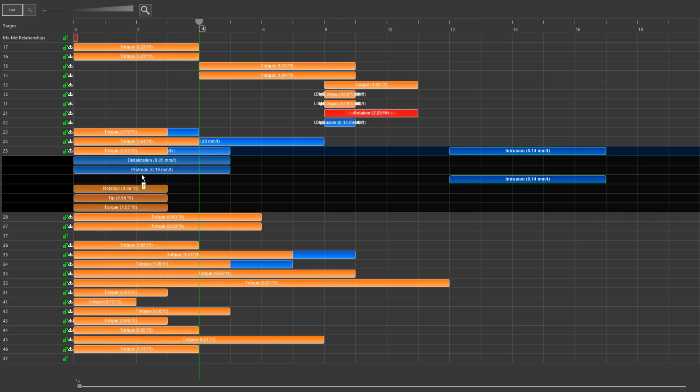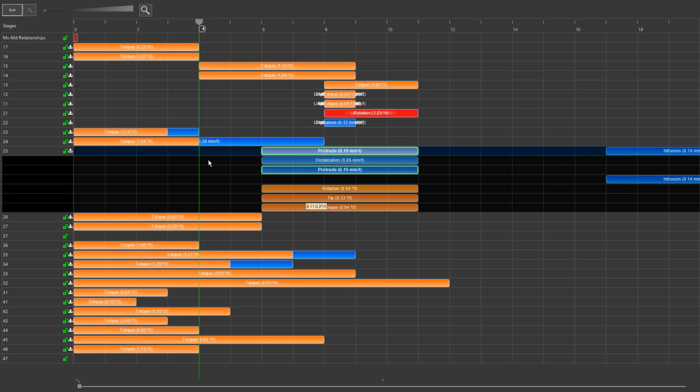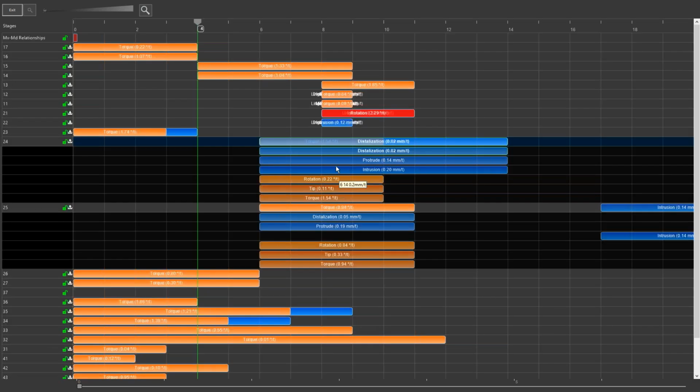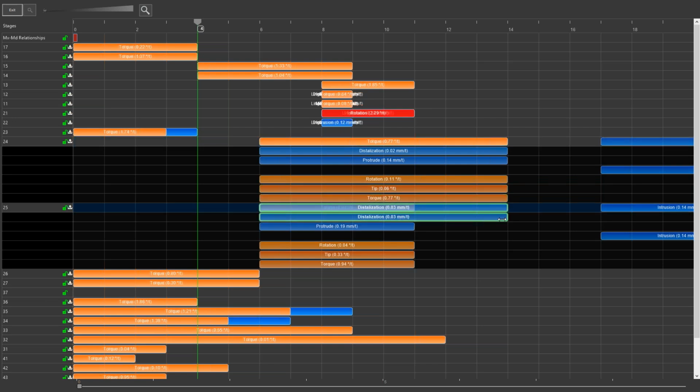So here is where I'm going to change the portion of this, and perform both my premolars again at the same time. The intrusion, I'm going to leave it at the end of the treatment so I get it out of the way. And here's where you start doing your own biomechanical combinations depending on what you need.